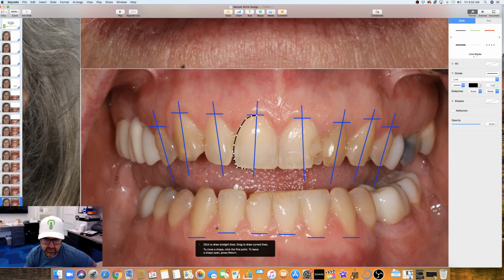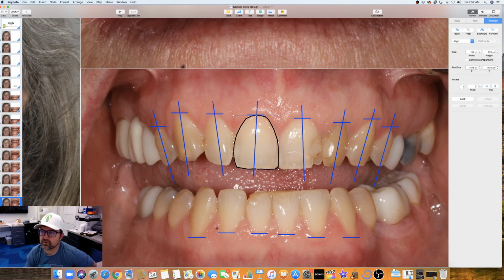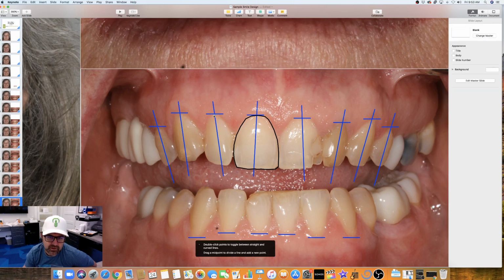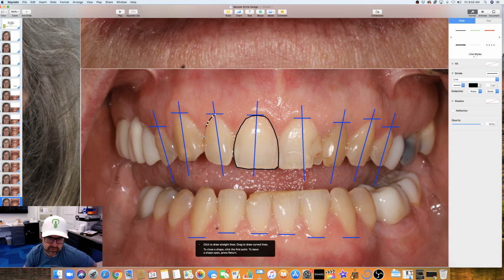You can outline the tooth as detailed as you would like. You can even incorporate the little chipping that you can see there. You just go ahead and do this on each tooth. At that point, you can change the color to the same as the blue. Right now, I'm just going to keep it black for a minute. We're going to just keep adding those, again just clicking on the free gingival margin, or just the outline of the visible crown of the tooth.